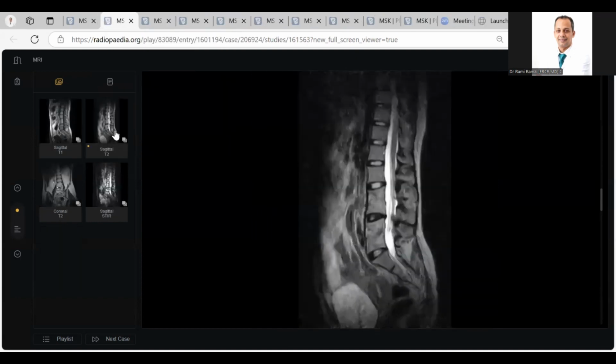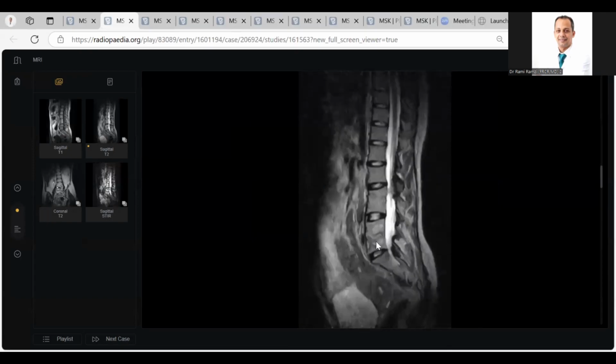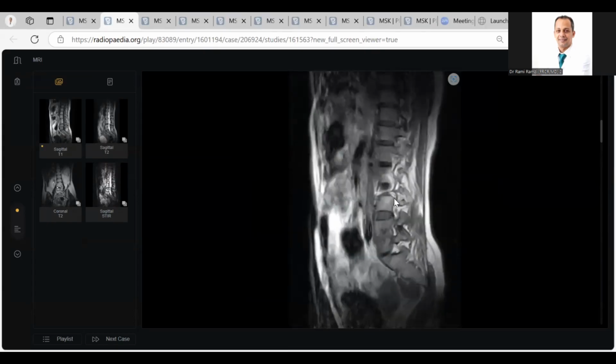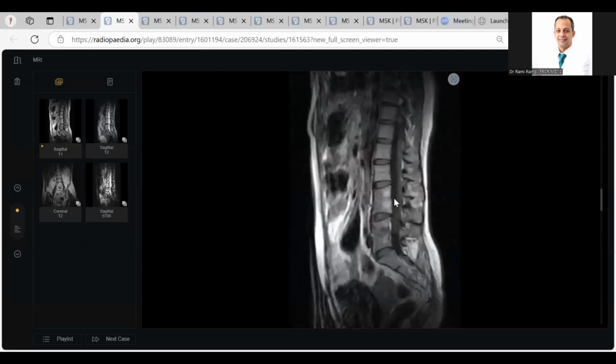This case was a startup case. You told me this is a blocked vertebra. No, how could a blocked vertebra be very high signal? So I told you, look at T1. Then you stood up again and told me, and you went in the correct way of TB spondylodiscitis.